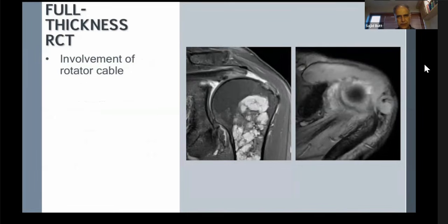When you see full thickness tears, like you see here, obviously it's important to identify that, but please be careful that for this exam, they can show you multiple pathologies. And in this case, don't overlook the big elephant in the room. This is a huge, bright T2 signal intensity lesion in the proximal humerus, which is most likely to be a chondral abnormality. So it's a chondral tumor, could be chondrosarcoma.